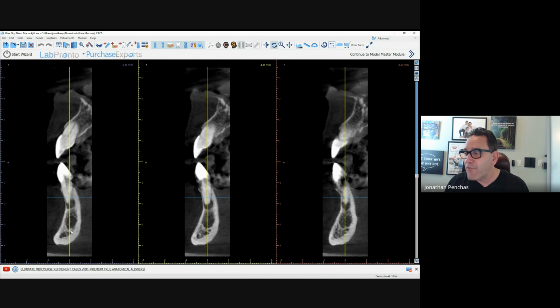So now what we're looking for is the bone itself. We can measure how dense the bone is. It's in Hounsfield units. 2100 is very dense. If you look at the cortical bone, of course, you see that the bone in the middle here is only 390, and you can see that the abscess is basically the same. So lots of different features help you understand what the pathology is like. Is it bone? Is it soft tissue? What's going on? Has it penetrated?